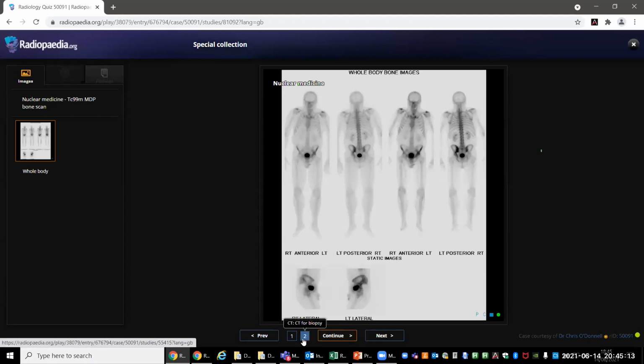So you think it's a sacroiliitis? I believe so, because it's on both sides, more marked on the right, but still I would go for an X-ray pelvis to be sure that what I'm seeing is only a degenerative process. Is this also part of the sacroiliitis? No, this is the anterior aspect of the left ilium. So this is basically the bone involved. So no, I retract my previous statement.